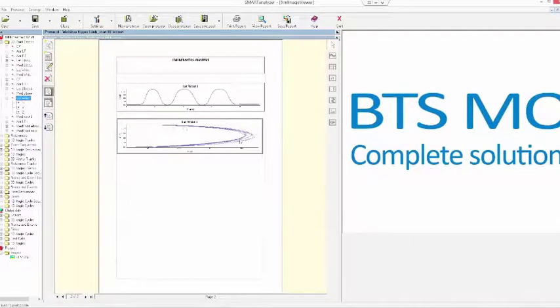This is the trajectory into a plane. Okay, so as you can see, you have on the x-axis the x component of the marker, and on the y-axis the y component of the marker. So the plane yx is the sagittal plane for example, and so this is the meaning of this type of visualization that we can use into our report.